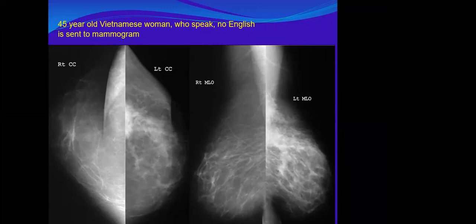At the same time, as technique, maybe it's not symmetrical. Okay, suboptimal. Yes, agree, it is suboptimal, but there is a global asymmetry on the left. Okay, what is next?